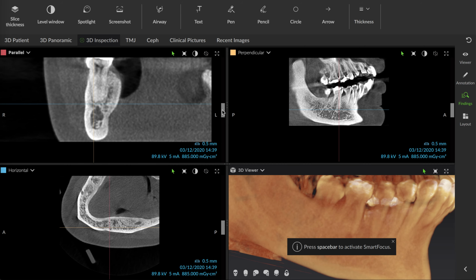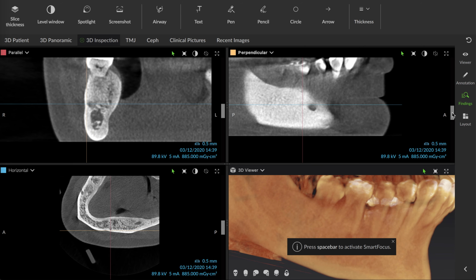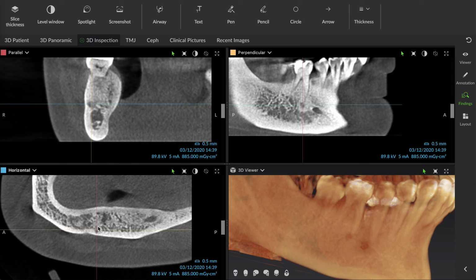But it's a solid testament to me of how powerful this technology is, for us to be able to see what's happening in 3 dimensions, and to be able to diagnose for our patients these lesions that we couldn't necessarily see otherwise. And this one really, on the panoramic, was barely a hint of a dark spot, but with this 3D modality, we could see it loud and clear, what's going on there on the mesial buccal.